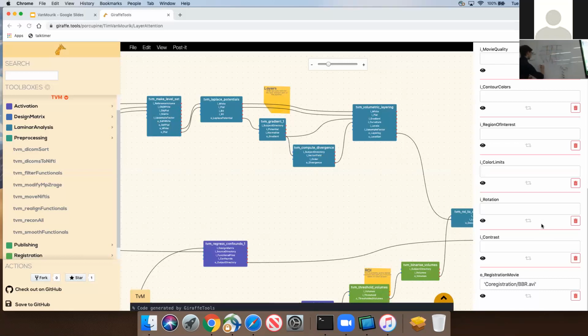So there is voxel 1, voxel 2, until voxel n is equal to, well, those numbers, those percentages that I just came up with, you could represent as a design matrix, as a layer-specific spatial design matrix, that for every voxel has a range of layer contribution.